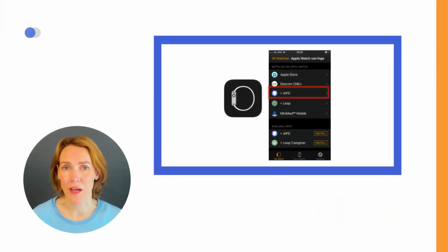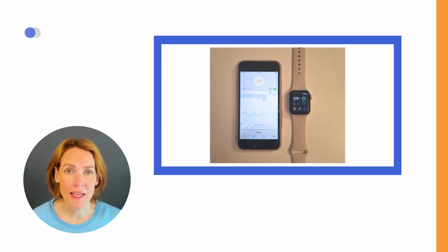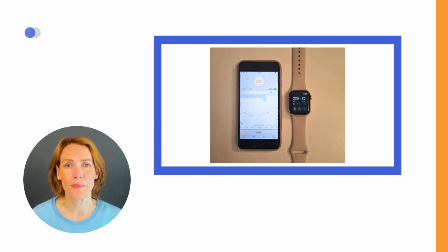Additionally, the iAPS app provides an Apple Watch version, installed during the same building and installation process. This allows you to view your glucose values in real time on your Apple Watch, bolus insulin, and even activate predefined profiles directly from your Apple Watch, adding convenience to your diabetes management.